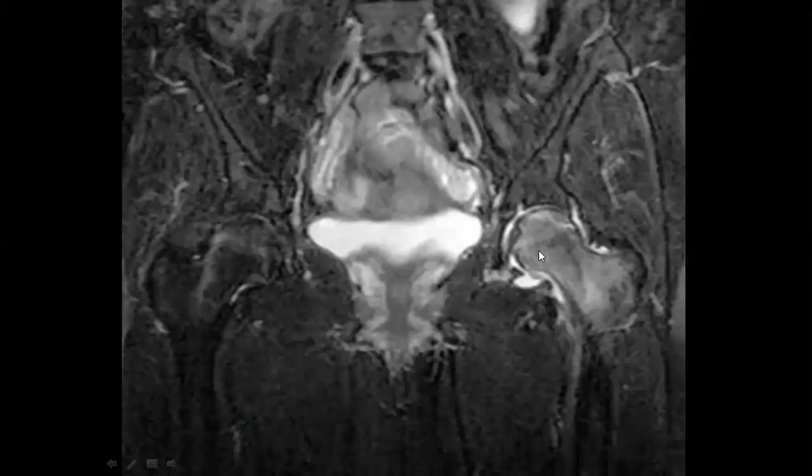Yeah, femoral head and neck, until the metaphysis. No, not geographic. Geographic, you will mention with avascular necrosis. Amna, no. Edema, perfect. So this is the word. You should mention edema.